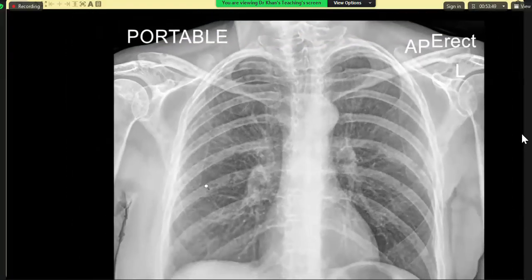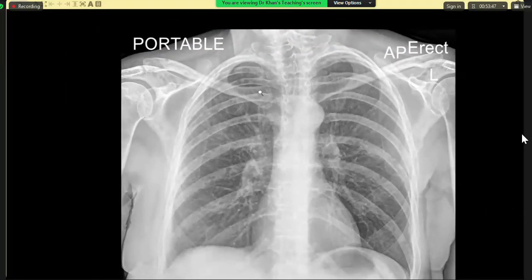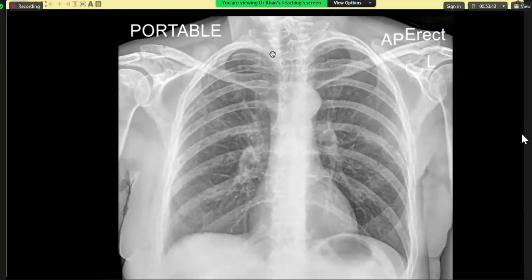After magnification, it appeared to be more clear. This is the point. So now you have picked it up. So what is your conclusion? I believe that this is a case of cancer breast with multiple lytic lesions extending to the bone, and I am also concerned about the reticulations noted within both lungs. Reticulation, just disregard. That is just projection.